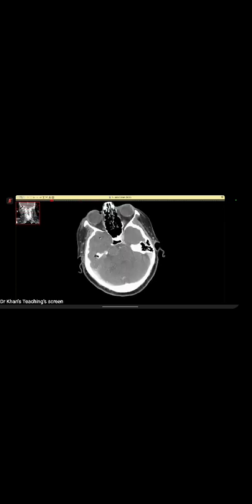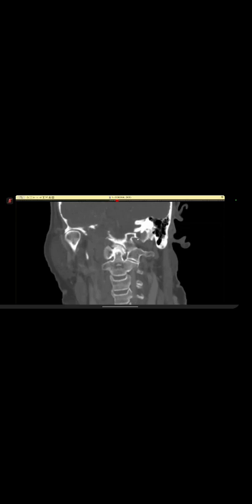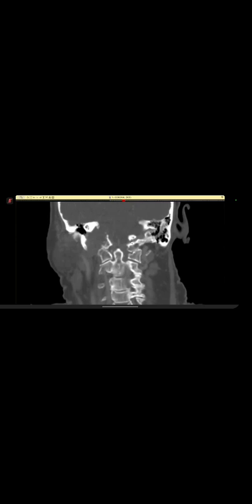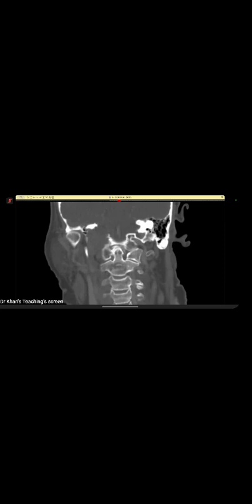And then we go to here. If you go to the coronal sequence, which is this one, look at the anatomy, you look for that eagle. Now, this is the eagle. Mr. Eagle is sitting here, and this is the beak, right? This is the normal side. So this is the hypoglossal foramen and then the canal, and this is the eagle. Where is the eagle? Gone, destroyed.